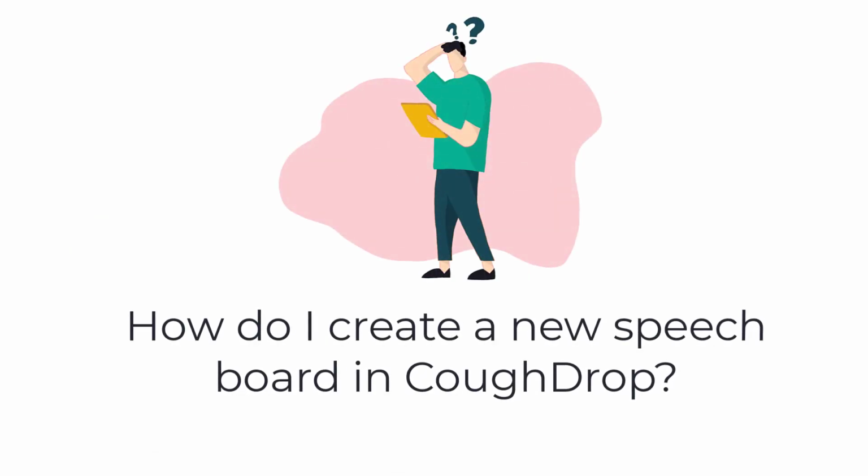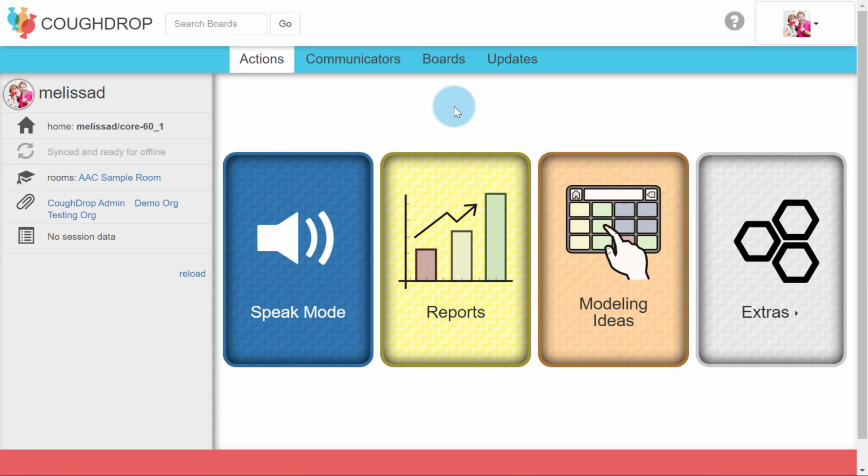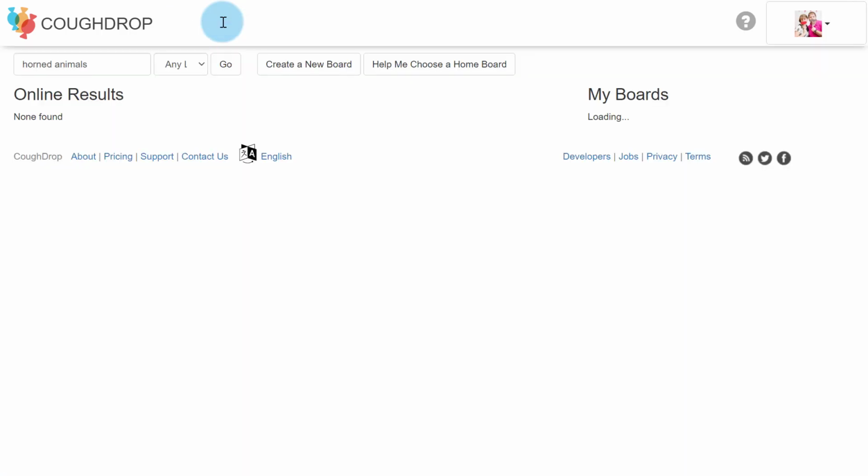How do I create a new speech board using CoughDrop? CoughDrop has a variety of public speech boards available that can be used by anyone, but sometimes you need a board that specifically fits your needs, so you need to design one from scratch.